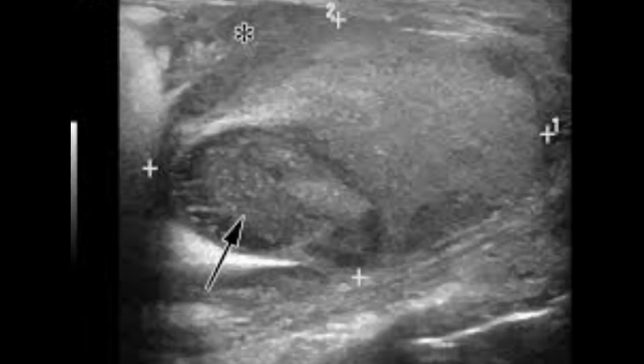In some of the patients you may be able to see a confluent lobulated mass, which I'm going to show you in another slide, and in some cases it might replace the entire testes. So far as cystic components are concerned, you cannot see cystic components particularly in this lesion, and there is no fluid debris. So this is a hypoechoic lesion. It is eccentric within the testicular parenchyma, and it is confined to the tunica albuginea.